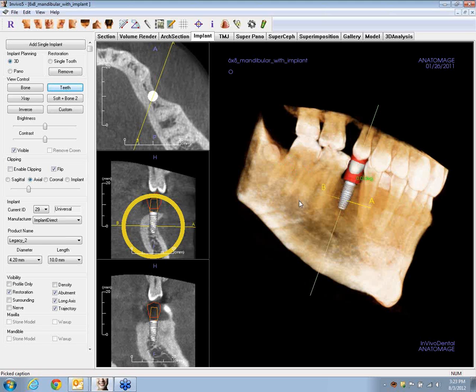And delete it. The angle measurements, again: we click the one leg, click a vertex, click the other leg and endpoint, and it shows you the dimension from the endpoints to the vertex and the included angle here. Get rid of it, click it so it's highlighted, and hit delete, and it'll go away.